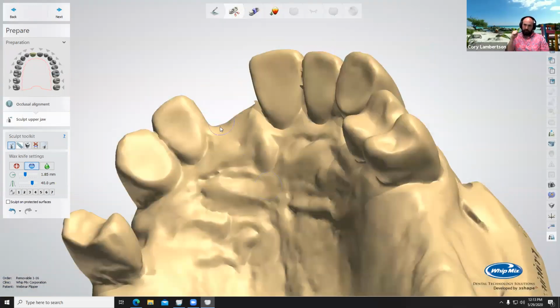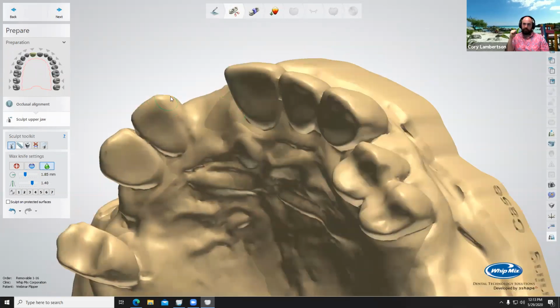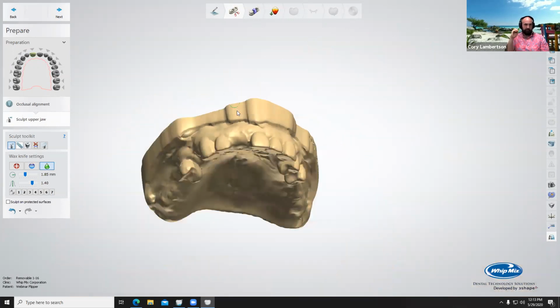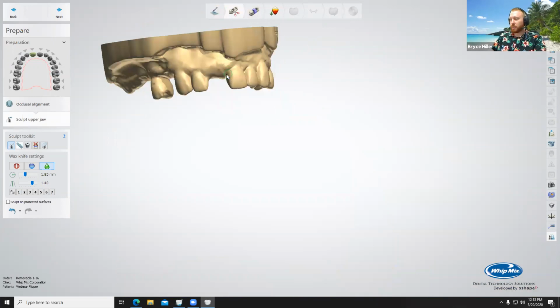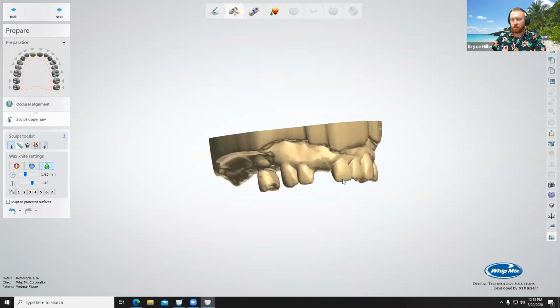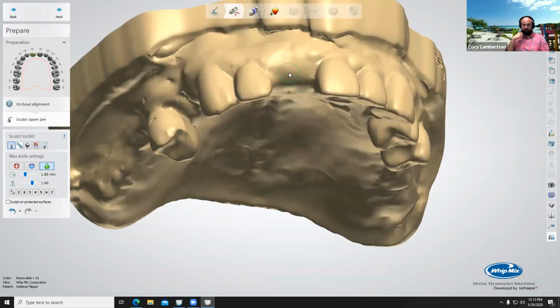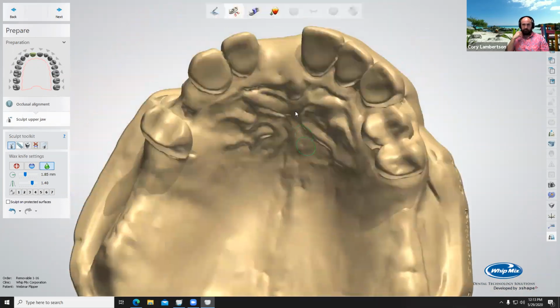Sweet computer, poor mouse. It's amazing how much a mouse makes a difference. It's the scroll wheel on this one, because to pan like this, you push the scroll wheel, and it almost slips a little bit. It's kind of weird.